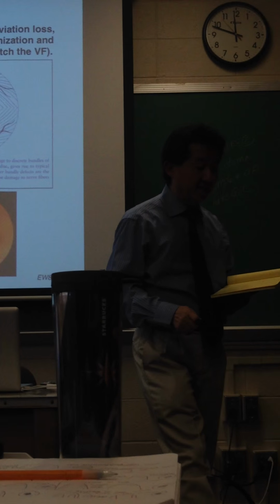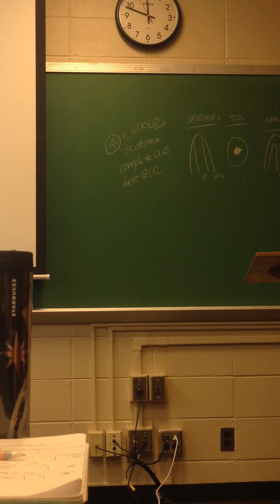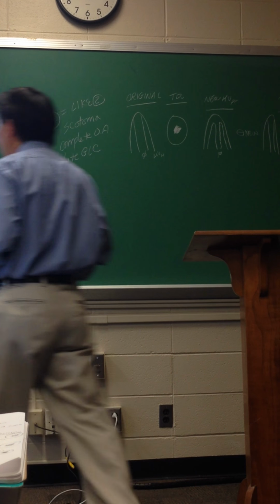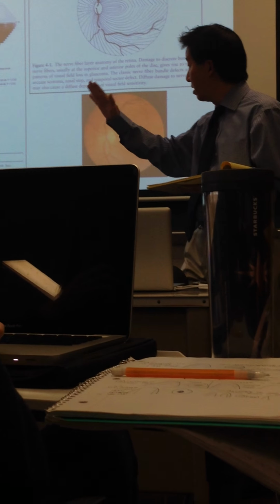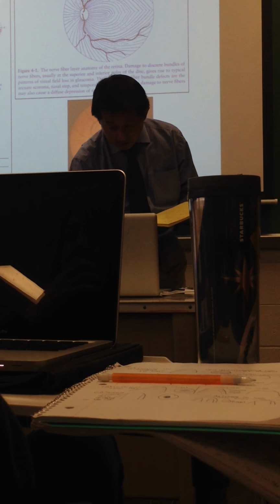You know, that could be from end-stage glaucoma in one quadrant or one sector. It could be from partial atrophy. It just shows you the depth and the distinctness of the edges to this defect, as well as no general loss. So there's no way you'd say, well, there's a cataract also. It didn't shrink, and it has sharp edges because it didn't expand. There's another one in here.